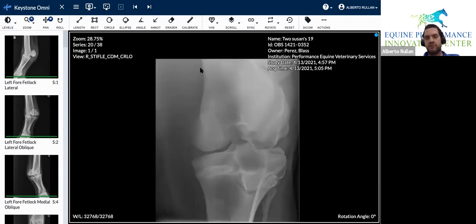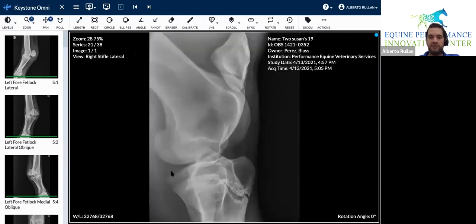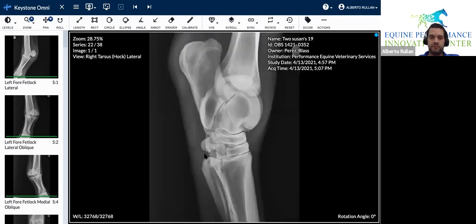Now this is in real time. I go femur, medial femoral condyle, lateral femoral condyle, lateral trochlear ridge, and then I go on the proximal tibia, medial tibia. I'm done with that view. Medial femoral trochlear ridge, lateral trochlear ridge, patella, femur, caudal femur, proximal tibia, eminence, done with that view.